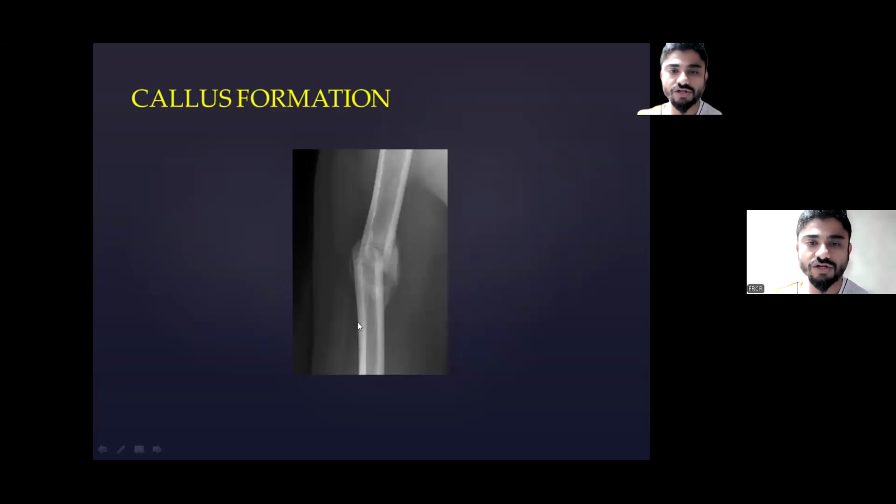So this is a fracture, and associated with the fracture: transverse fracture, lateral apex angulation, maybe slight translation, slight 1/4 translation towards the lateral side, and there is periosteal reaction on the lateral aspect. On the medial aspect there is periosteal reaction and a good amount of callus formation. Since there is slight angulation deformity at this level, this fracture should have been corrected at the initial point.